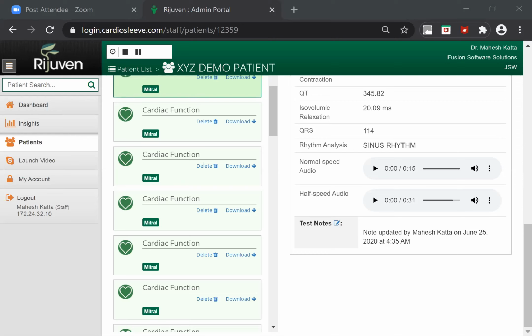Next, the one is the ECG report. You will see the 3-lead ECG, lead 2, lead 3, and lead 1. This is a report for ECG, and it will show green and red where the intervals are more. And the next one is the cardiac function report. As I explained, there are four parameters. Okay, and we have given the explanation also here for the people. Since this is a new technology, we have given the explanation to them.